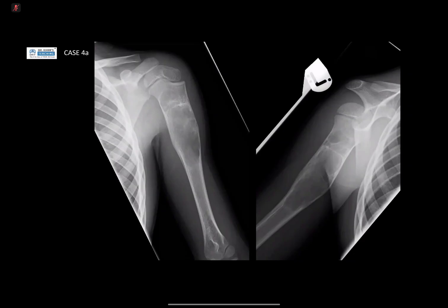Fibrous dysplasia. Okay. And what other things occur in children in this location? Aneurysmal bone cyst, ABC. Okay, so we've just seen an aneurysmal bone cyst, and they tend to be eccentric, so this is fairly central. And predominantly within the diaphysis, extending into the metaphysis proximally, I guess, but it's predominantly within the diaphysis.